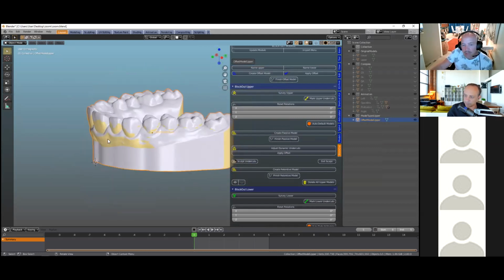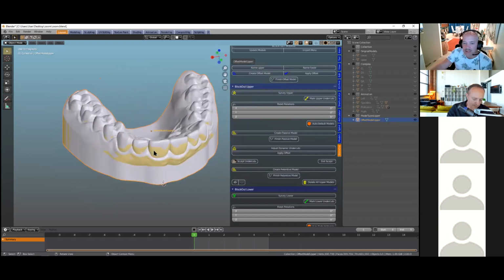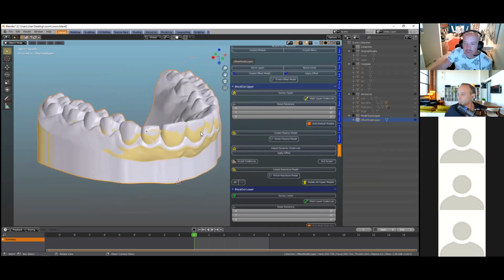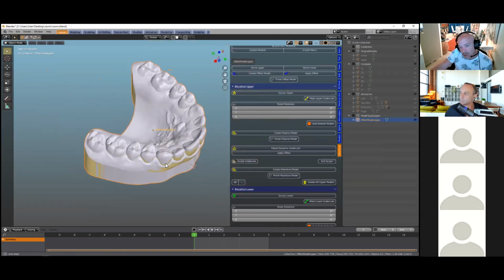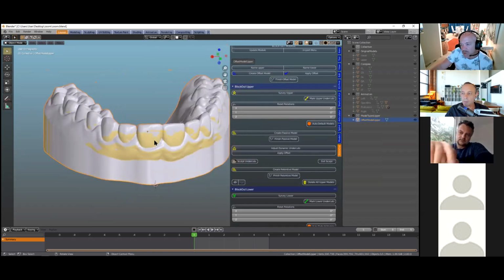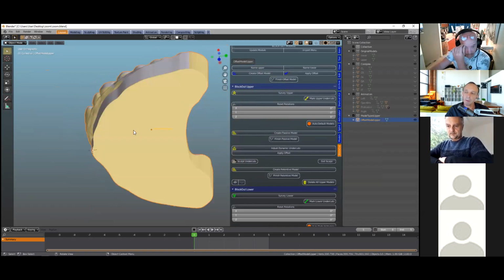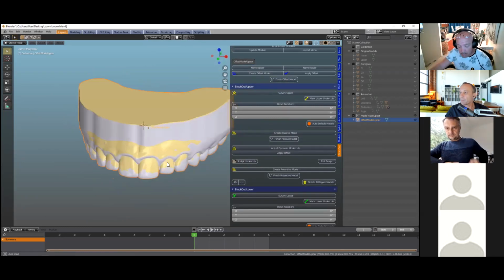We'll just use this one for now, because honestly, there's not much retention. Even if you got it in front, in the back you don't have any reciprocal retention. Okay, it's just something to keep in mind, I guess. Okay, so this is the next step that we've finished.